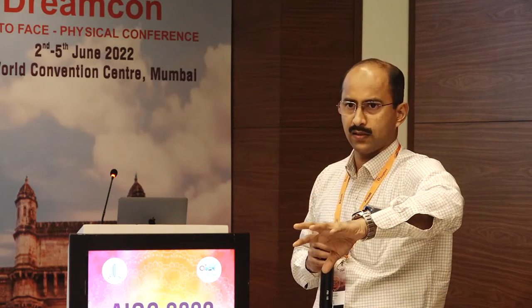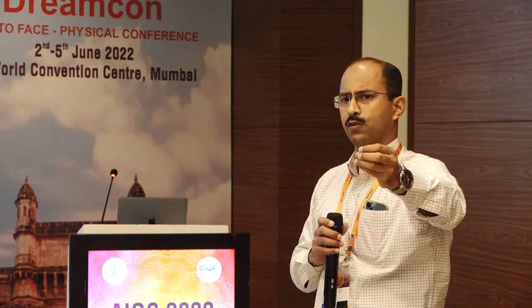Because when you are doing a manual scanning circle placement, many things can go wrong. If you were there for my first talk, you would have realized manual scanning circle placement is out, it is history, it is dated. If you want to place the scanning circle with your own hands, it is fraught with errors, it will just give you a one-time diagnosis. If you want repeatability and if you want the correct answer, it has to be an automated BMO centered scan. That's it. And that will not be possible unless you have a high-end machine. Okay, thank you.